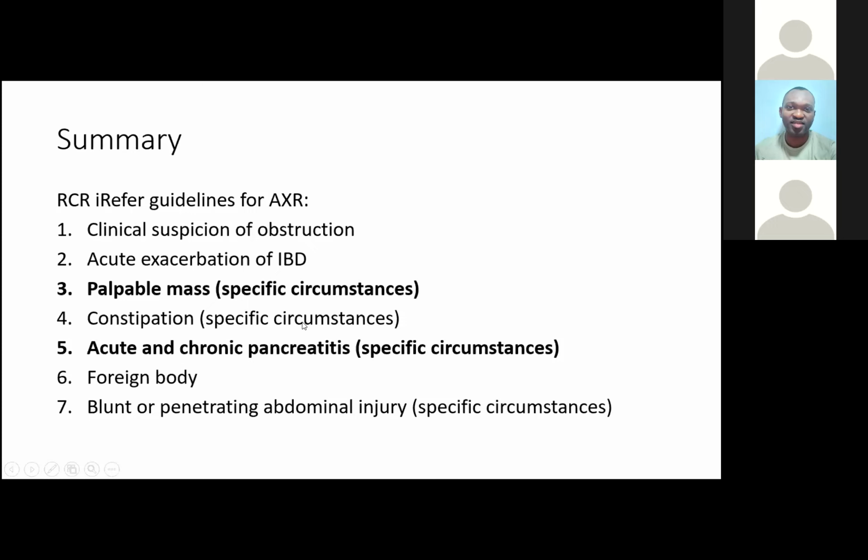Then straight after that, I would look for abnormal gas distribution. On an abdominal X-ray, abnormal gas distribution, i.e. extraluminal gas, means pneumoperitoneum, for example. That's what's called Rigler's sign. So you can tell from that if the patient has a pneumoperitoneum, and also retroperitoneal gas. Those are the things I would look for straight after assessing the hollow viscera. Are there any other abnormal locations for gas? So pneumoperitoneum, retroperitoneal gas, pneumobilia, portal vein gas. And then after that, I'll assess my solid abdominal viscera.